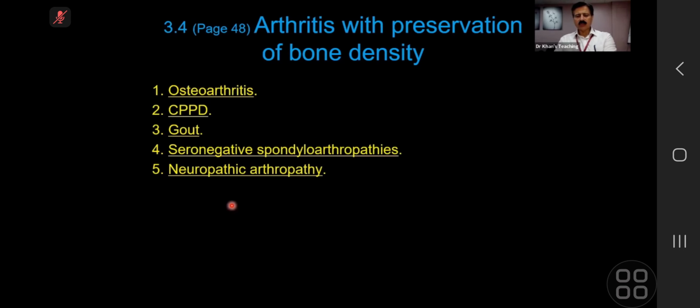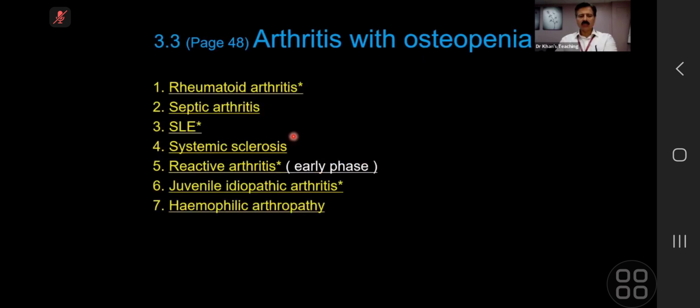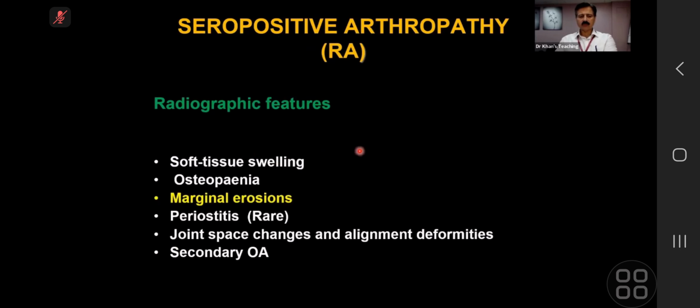And bone density can be generally reduced or it can be periarticular reduction of bone density. So this should be your pertinent negative or positives. At times in the exam films, because of radiographic factors, it becomes a bit difficult. You can say that keeping that in mind, whatever your opinion is, and the examiners will correct you. They will not discredit you, but take home point is that this should be one of your pertinent negatives or positives and will help you classify the film into either of these two categories.